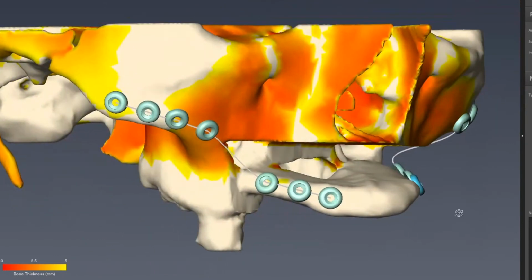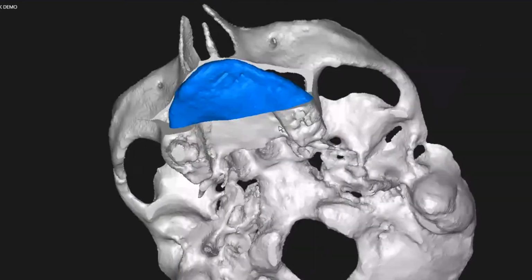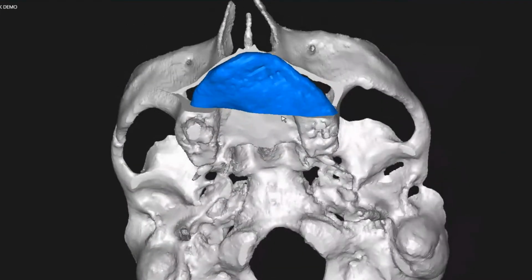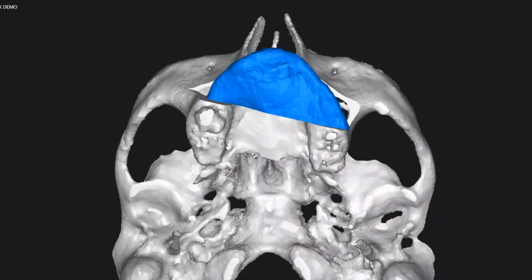Now, can you move those screws on the scapula a bit further back? Yep, and we can place the implants if you want to get those positioned in ideal bone, and then I can pull them into the plating software so we can design around them. So basically, I'm just looking for 4 implants. Okay. And is the 4.0 size okay, or did you want to use a different size? Which size, sorry? 4.0 by 10. 10 might be a push on here, but let's see.